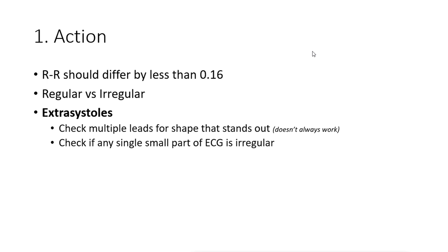We'll get to examples of it now: what is an extrasystole and what to look out for. There can be multiple extrasystoles in one lead. And one thing that I wanted to highlight, very important, is that an extrasystole is not representative of the heart activity.